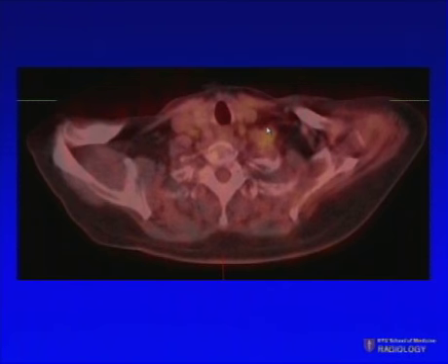And the way we also knew that is we've been following this patient for approximately 2 years. There's really nothing on conventional imaging that showed a discrete lesion. And it's been described in an article in 1999 in the European literature that PET scanning may be beneficial in differentiating radiation fibrosis from metastatic disease, but it's not something that we routinely do.